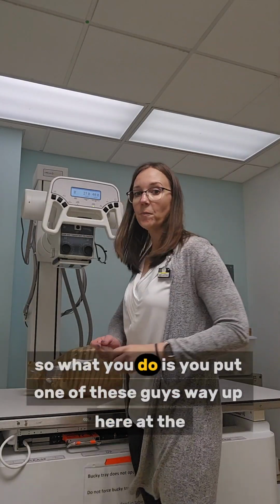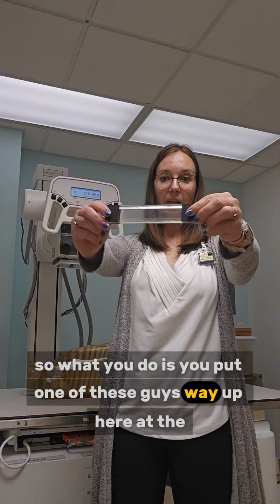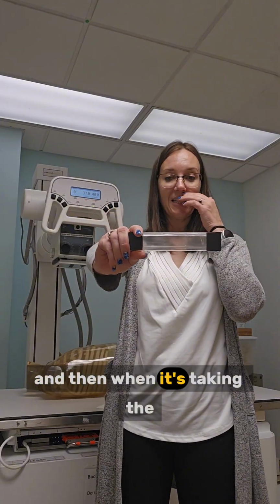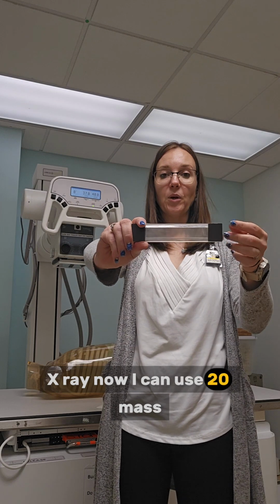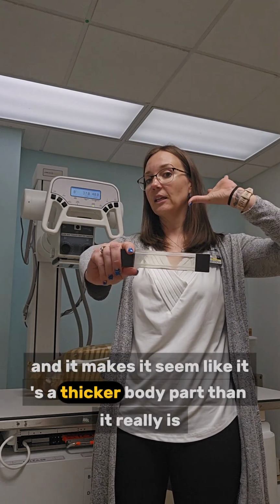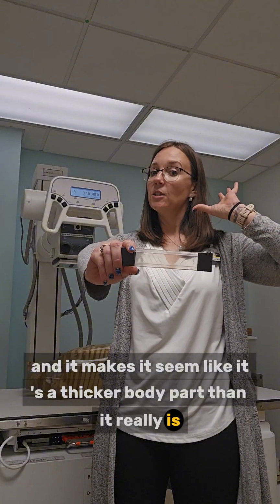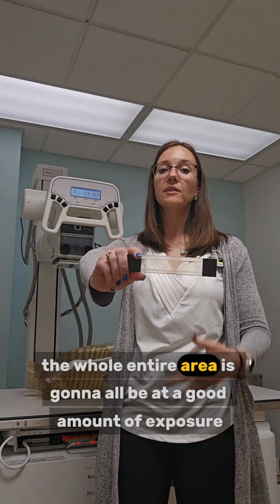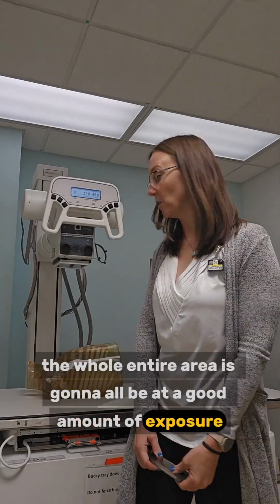So what you do is you put one of these way up here at the x-ray tube, and then when it's taking the x-ray, now I can use 20 mAs and it hardens the beam and makes it seem like it's a thicker body part than it really is. So now I can use that 20 mAs and the whole entire area is going to be at a good amount of exposure.